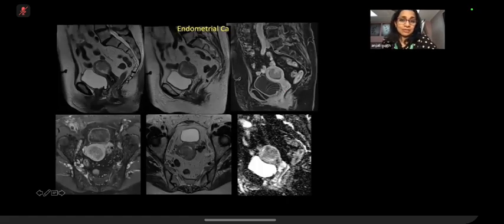Okay. Now we've come back to our same case. Now, can you stage this disease? This is endometrial CA. We've gone through the staging. Now the disease is confined to the uterus. So can you stage this disease now? Candidate 3? Yes.